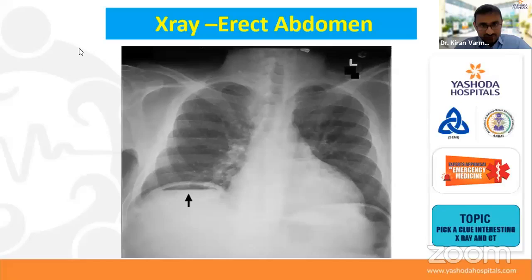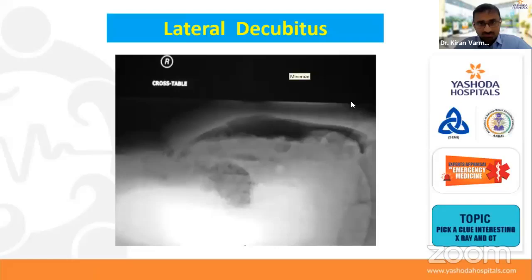That's for sure. Arrest. Decubitus, Usha. Decubitus means what? You're right. Yeah, given half of the answer. Yes, exactly, Vinayak. What you do, correct. Left lateral decubitus. Left lateral decubitus X-ray. Okay. So when patient is unstable, don't subject him to go for the X-ray abdomen, but subject him for the lateral decubitus X-ray. So can you see it here?